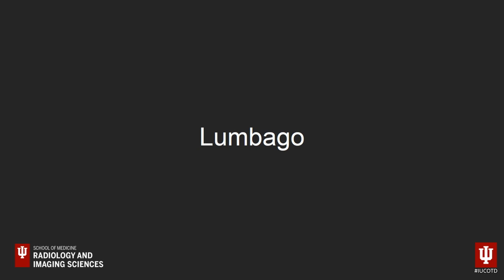So I'm going to obfuscate the actual clinical history just a little bit for this case because I want to make it a little bit of a challenge and I want you to think through things. So this one goes out to Rick Wiggins. This patient presented with lumbago, the forbidden dance. So this is a pretty generic indication. Patient showed up with back pain, something we see all the time, and truth be told, this patient was having back pain, and that was why they were imaged, but there's something else going on. So let me show you the imaging, and I want you to try to put that together.